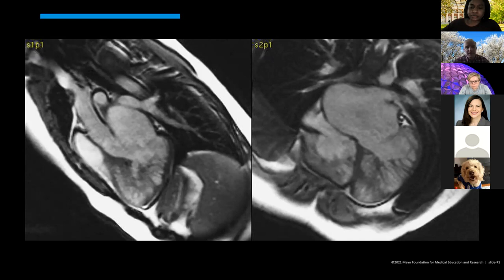And a ratio that is commonly used to try and decide if this is normal or abnormal is 2.3 to 1. I don't expect they would show you a subtle case that's on the border. If they are going to show you a case of non-compaction, it's going to be a very obvious case like this. You do not need to measure the ratio here.